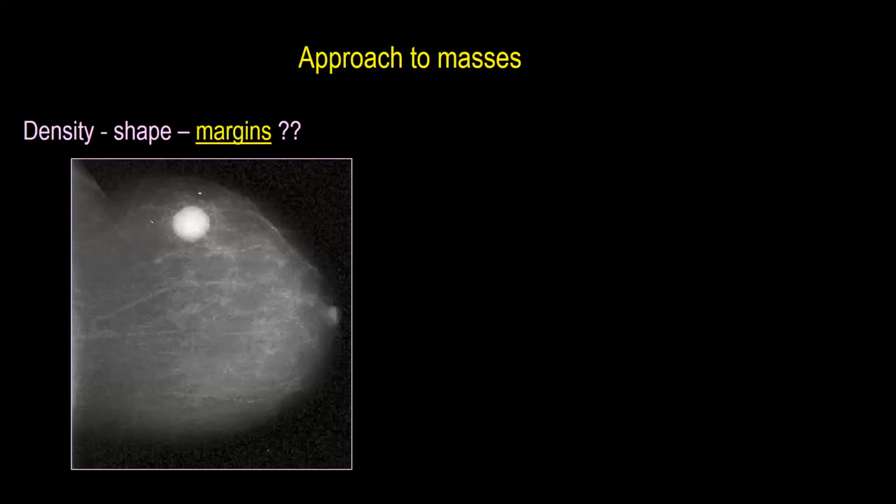That is why they gave each descriptor a BIRADS label. According to the descriptor, put your BIRADS. Then you can upgrade. Then we'll go for ultrasound. If you find on ultrasound this lesion is a simple cyst, then we'll downgrade it to 2. If we find it a complicated cyst, we'll downgrade it to 3. If we find it a complex cyst or a soft tissue, then we will go for biopsy. We'll leave it as BIRADS 4C.